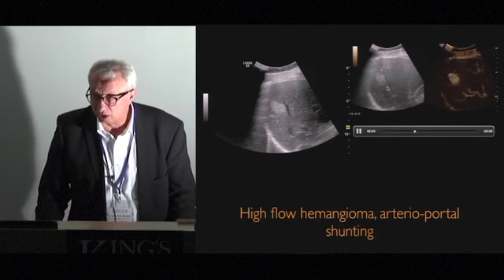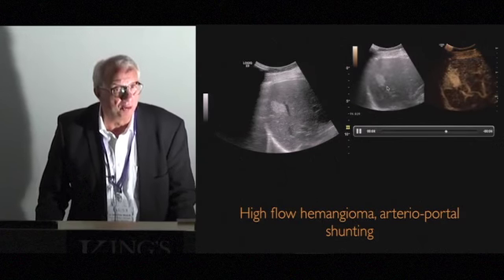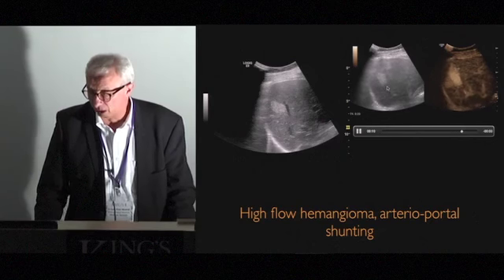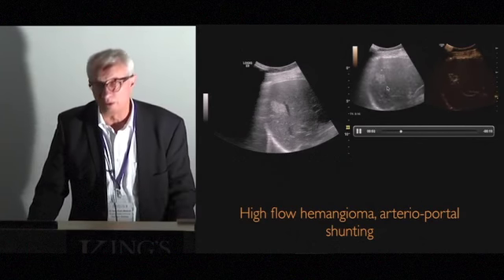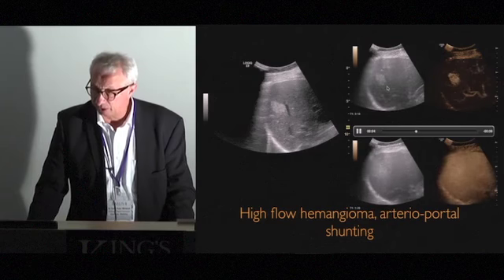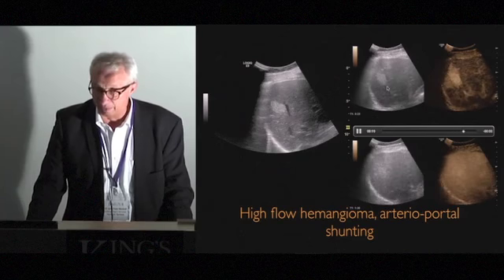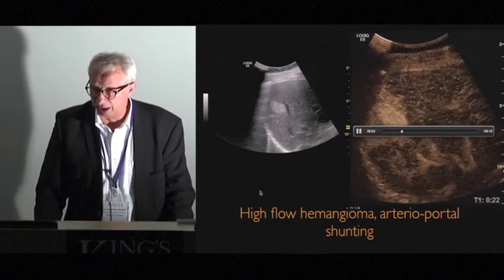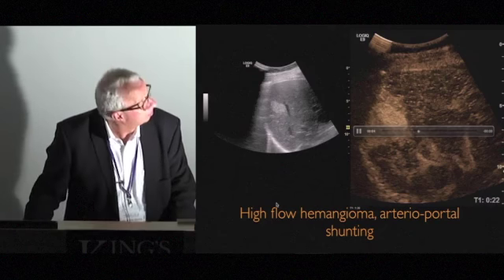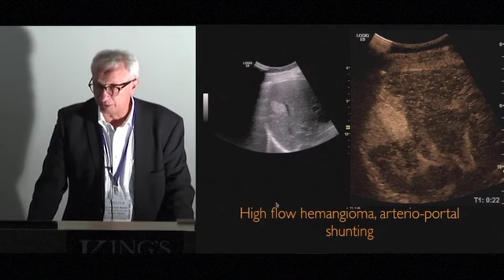But here also shunting in these hemangiomas. So that is not a rare finding, so you can see that quite often in hemangiomas, if you look very carefully during the arterial phase. And this is later, during the late portal venous phase, you don't see any enhancement. Okay, so this is again the still frame from this arterial phase after 22 seconds.